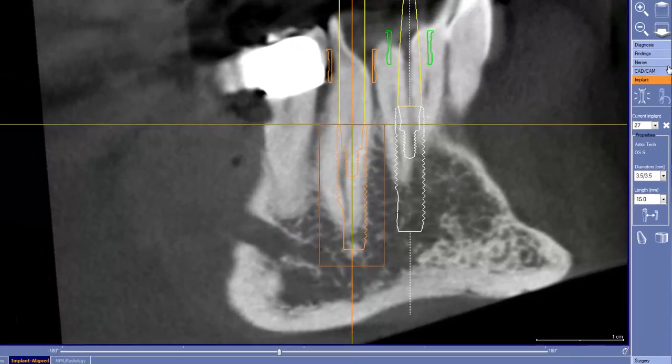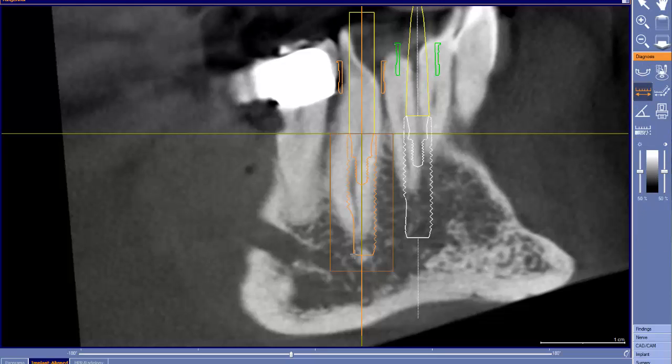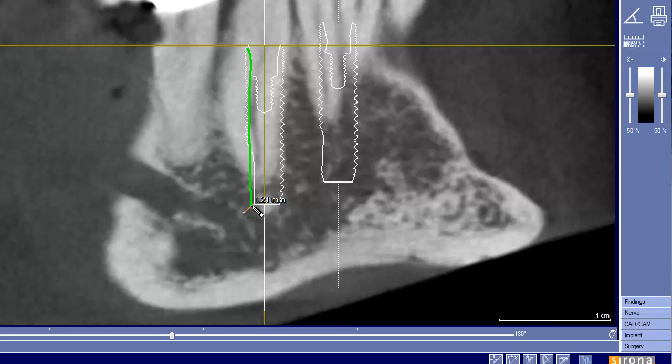To give us an idea, let's look at what kind of distance we have here. From the end of our implant to the nerve, we have 1.21 millimeters. Now, as I've taught in our programs, the drill for these implants is always longer. So the drill for this implant would actually be something like that. Now our distance is less than 1.21. In fact, our drill on an average number, again, it's very specific for each system, so don't go by average numbers, is about 1 millimeter longer. So really we're about 1/4 millimeter away from the nerve.